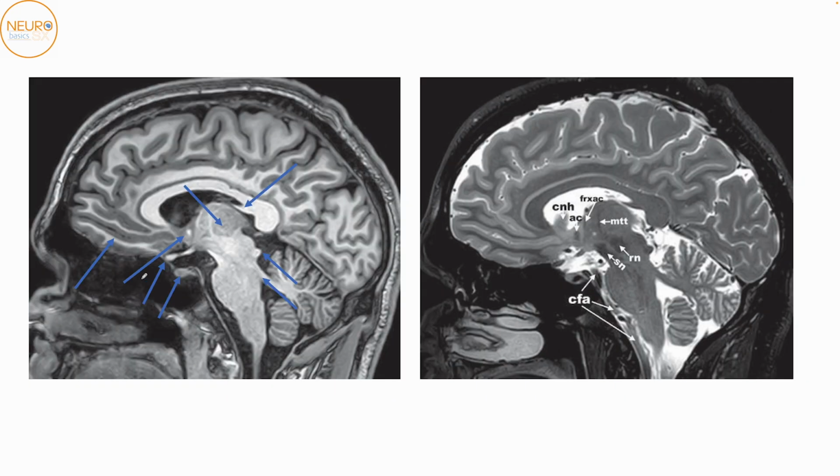Okay, coming next to almost the midline cut. Okay, a few very obvious things here. Again, you've got the corpus callosum. Thick and thin side will help you still identify the pre and the post central. So will the pars marginalis over here. So most likely it is this and this, as this is the pars marginalis.